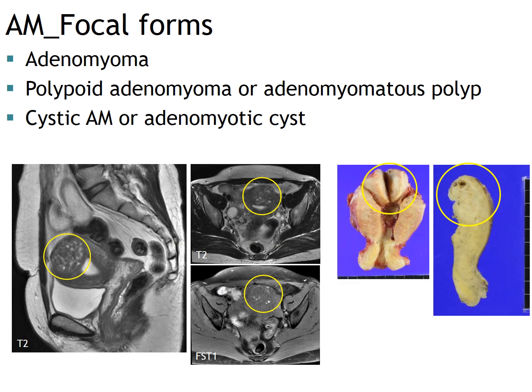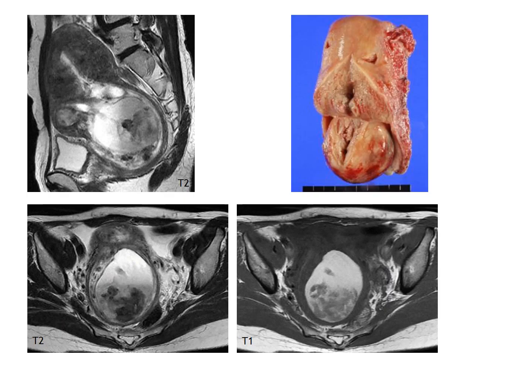This is a case of focal mass-forming adenomyosis or adenomyoma in the uterine fundus. This is a case of cystic adenomyosis or adenomyotic cyst involving uterine cervix.